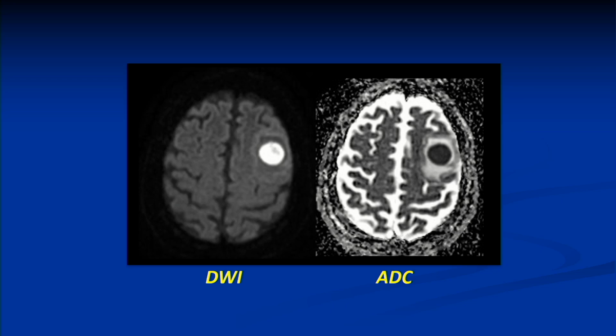If you're not expecting it, you can also have several differential diagnoses, like neoplasm being an important one. Now this is a pretty classic case, but what if the rim isn't as smooth? What if it's a little irregular? What if you're a little equivocal on whether it's a neoplasm or actual abscess? And sometimes symptoms don't help, right? In 30 to 50%, you're not going to have that classic fever. So you might not even have too many symptoms beyond the mass effect from the edema, which can cause seizures, et cetera.